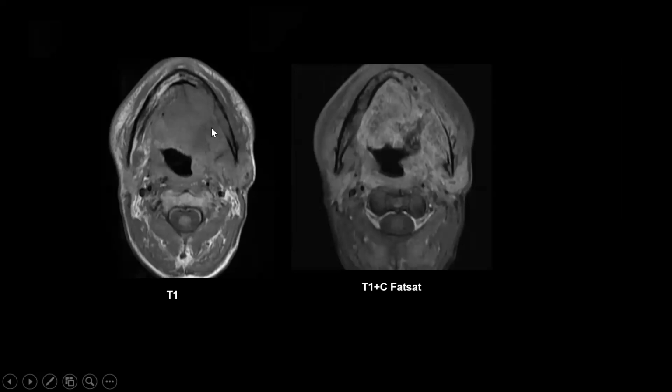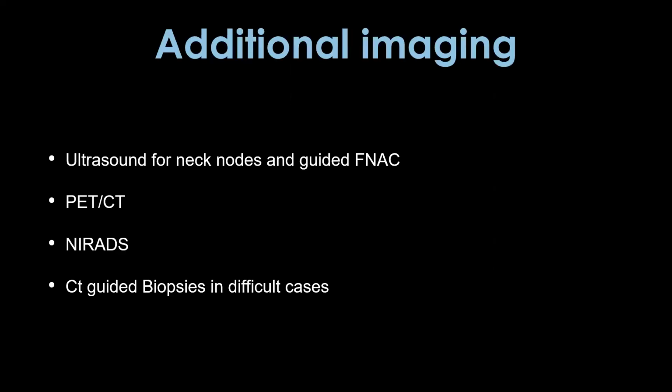An important point is this, as I said, marrow involvement. So we can see on T1, we can see marrow on the right side, which is replaced by soft tissue on the left side. So that is how we note marrow involvement. Enhancement is extending up to the midline, but the true extent of the lesion is short of midline on the left side. This is more important in smaller lesions. When this is an extensive disease it matters less, but when there's a smaller lesion, it becomes more important. We have to carefully see T1 and post contrast.